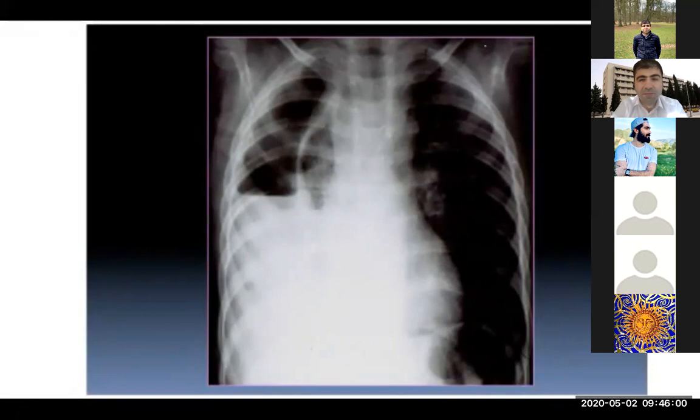And for the parenchyma there is darkening of the lung in both sides. Okay, it means this is over penetrated, right? Yes. It's over penetrated. So what's about F? You mentioned the F, it's dark color. Yes. But you see here, there is effusion here and there is fluid level. So this is air fluid level. It means there is some kind of fluid in this side, right? This is the normal lung. Yes. This is the fluid level.